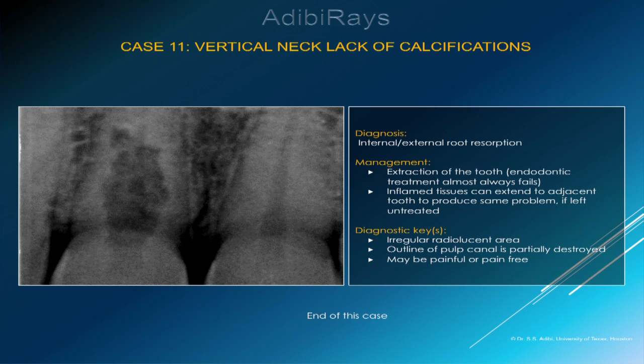The key diagnostic feature in this case is the irregular appearance of the radiolucent area, with the outline of the pulp canal partially destroyed by the inflammatory process, regardless of the existence of pain.